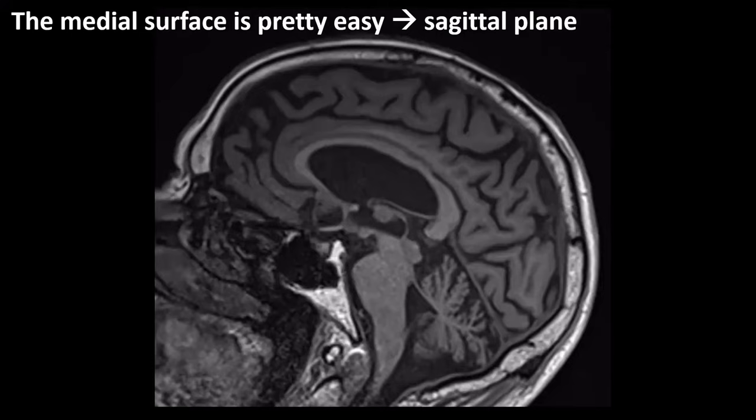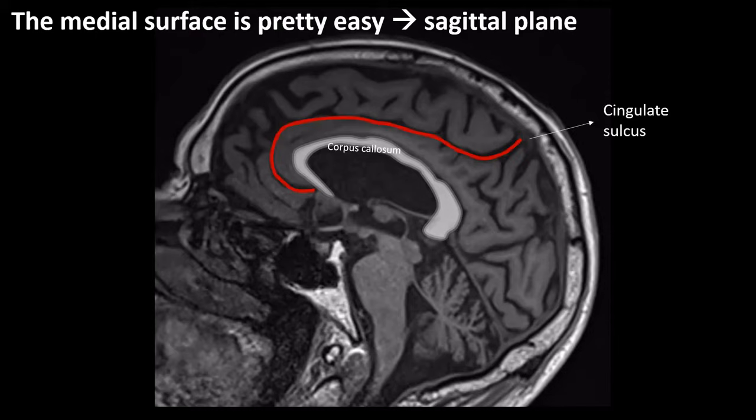Just as easily. Let's start with our sulcal landmarks. And to my students, I always say, these ones you have to know for the exam. Oh no, I'm starting with the corpus callosum, which we can always nicely see in the mid-sagittal plane. Now let's show you the sulcal landmarks. We have the cingulate sulcus, which runs a bit parallel to the corpus callosum and then extends upwards. And this very small upward extension is also called the marginal branch. And we will encounter the marginal branch later in this presentation again.